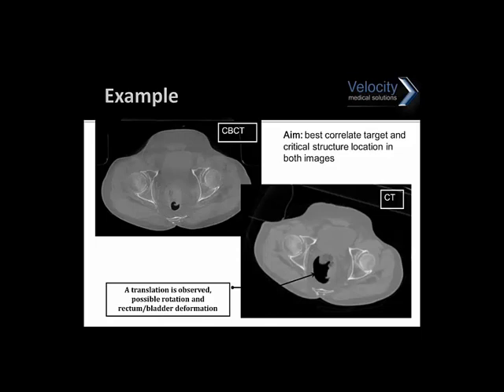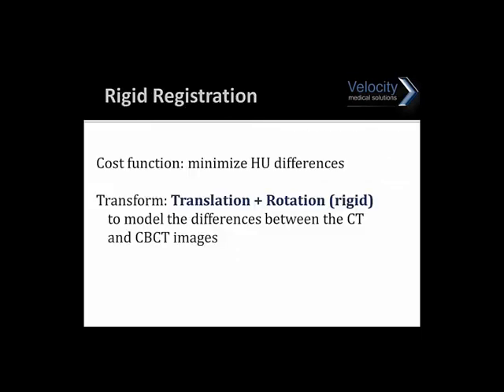Now, a function that we're going to show will be to minimize the Hounsfield differences, right? So we'll assume that if bone is of high value, if it's lined up with bone, then subtracting bone from bone should zero out. So if all the tissues are matching and they're on top of each other, that's when it's all zeroed out, and the Hounsfield unit differences are minimized.